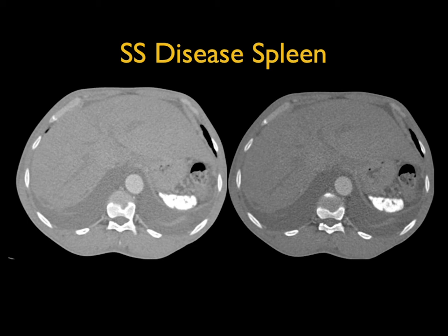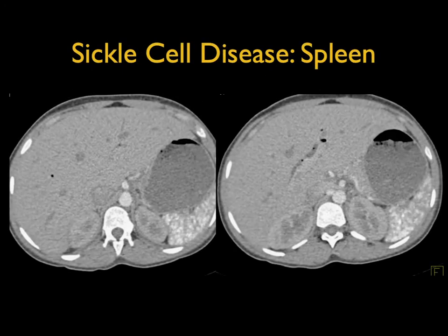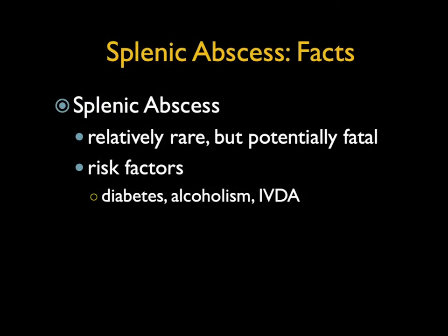In patients with things like thalassemia or sickle thal, the spleens can be large, but in patients with SS disease, they're typically small. Another example where there's a moire pattern, but that's the permanent moire pattern. That's the patient's diffuse splenic calcifications. Here it is nicely shown in the coronal view. Okay, very nicely shown.